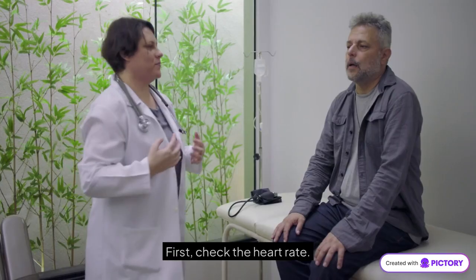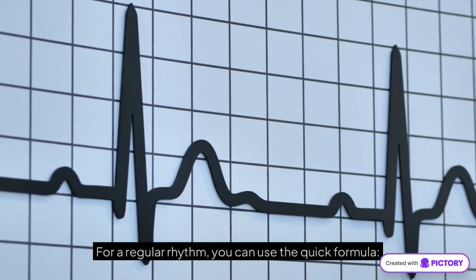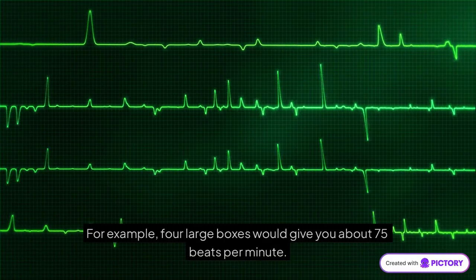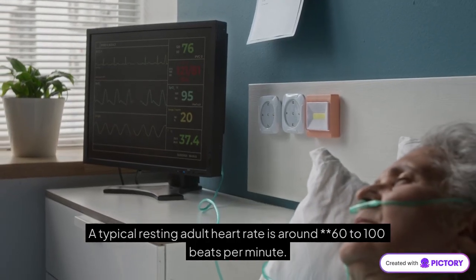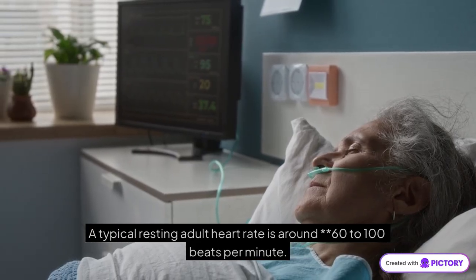1. Heart rate first. Check the heart rate. For a regular rhythm, you can use the quick formula, 300 divided by the number of large boxes between two R waves. For example, 4 large boxes would give you about 75 beats per minute. A typical resting adult heart rate is around 60 to 100 beats per minute.